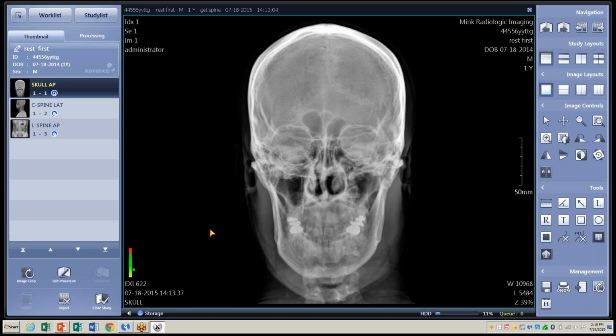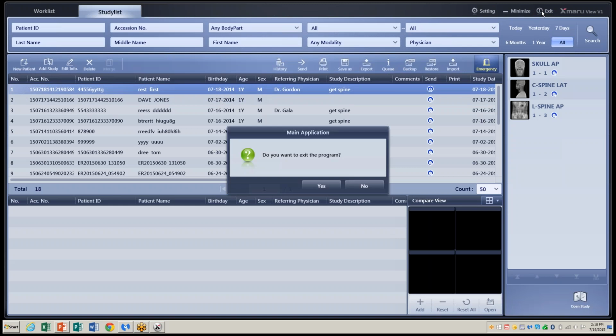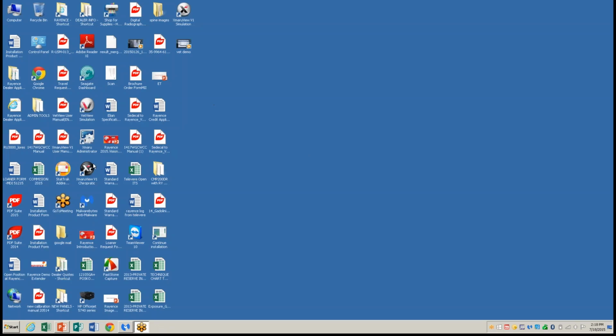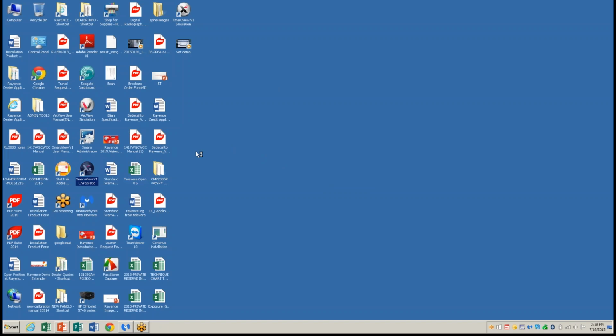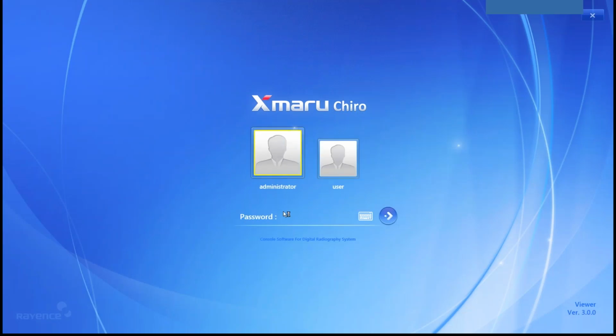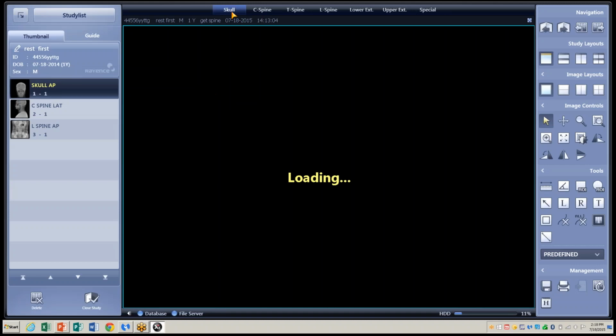All right. When you've completed everything you need to do with it, you will find on your individual computer, outside of the workstation, a separate little program, which is our viewing program, and this allows you to do further processing of the image and be able to do measurements that are more sophisticated than the ones listed on our current workstation, and these are included at no additional cost. You'll get those as part of the system, and when the patient's files are moved over to your individual computers, you will have access to up to about 75 different measurement tools, and they're all marked along the top.